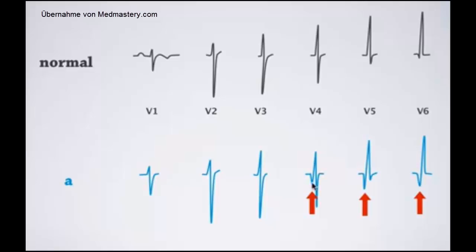Look, here the Q wave increases as we go from V4 to V5, but then it decreases again. So that's definitely abnormal, but they're also a lot bigger than the Qs that we would expect in those leads. So the solution is that this patient had an anterolateral infarct, which is most pronounced in V5.